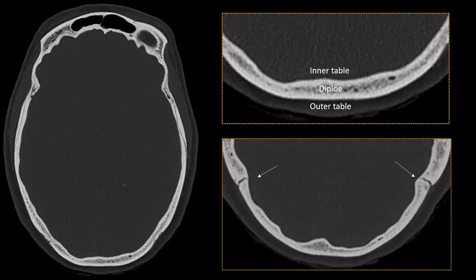If we show you a close-up of another part of the skull, we see these lines coursing over here. Are those fractures? Well, they aren't, and you will see lines like those on every CT of the skull. These are the so-called sutures. These are the places where the several bones of the skull have ossified with one another, so to say, and you can distinguish them from fractures because you have the symmetry. There's often a similar line on the contralateral part of the skull, and they often have a sawtooth appearance, running a bit zigzag through the skull, and have sclerotic margins.